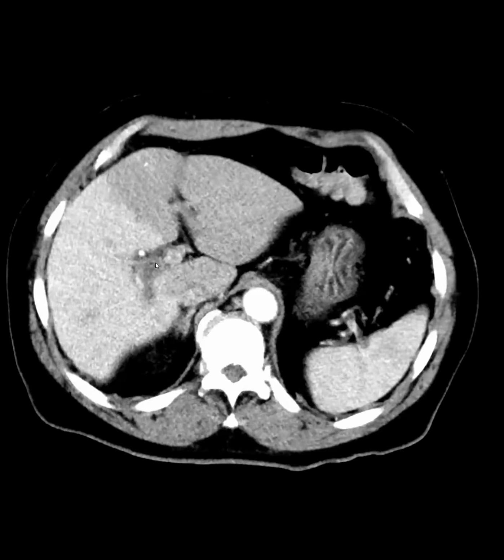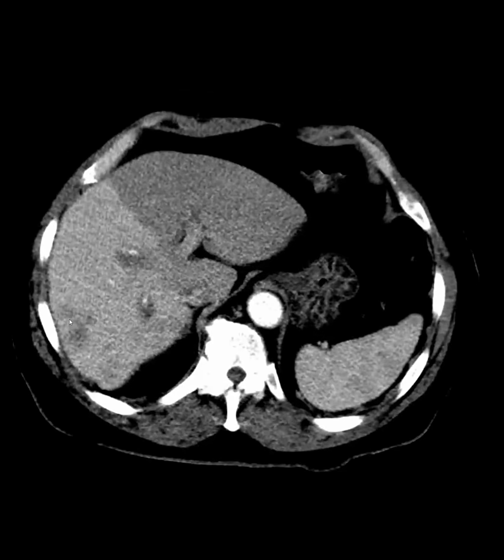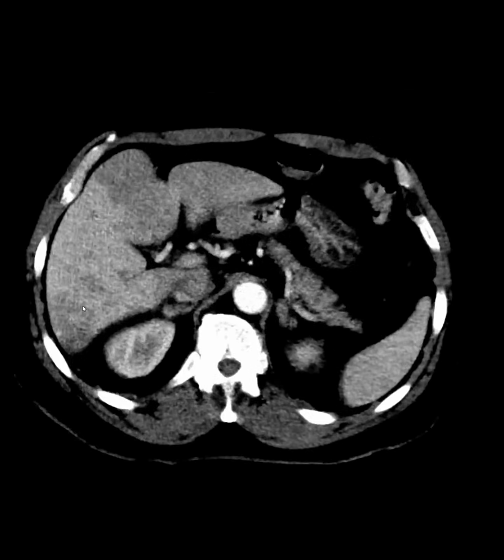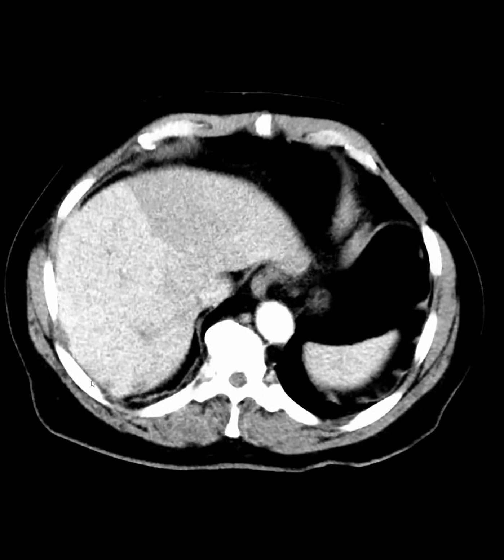The left portal vein is fine, right? The portal vein isn't clotted out. And then the heterogeneity, like you said, there's a mass there. It looks like a tumor, like tumor in vein. Okay, that's one possibility.